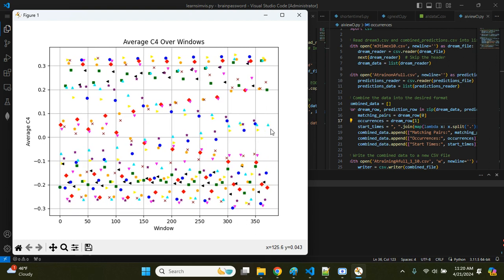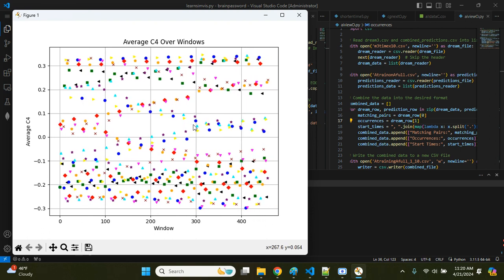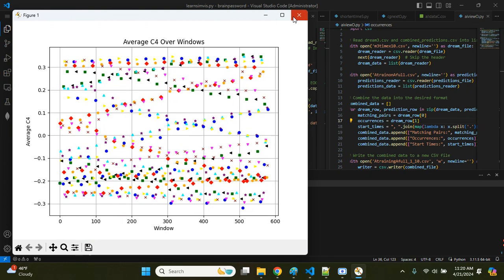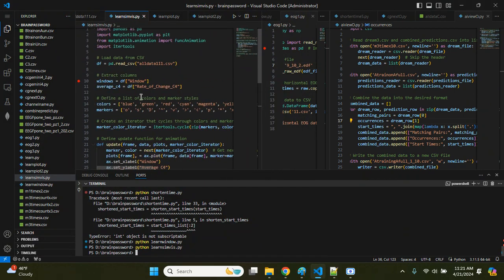This is not the visual that I had. Oh yeah, because I changed the parameters. But this also is a good visual of just brain data. But the best visual was when I changed the parameter to match the markers, basically.